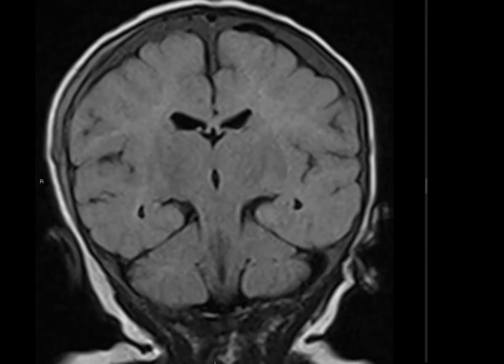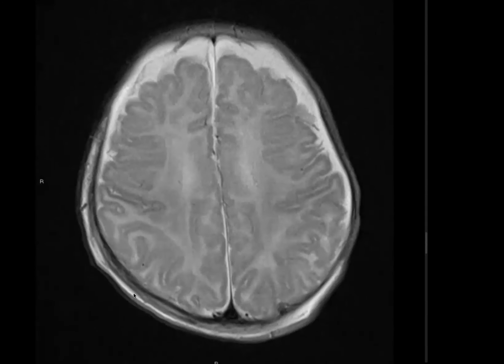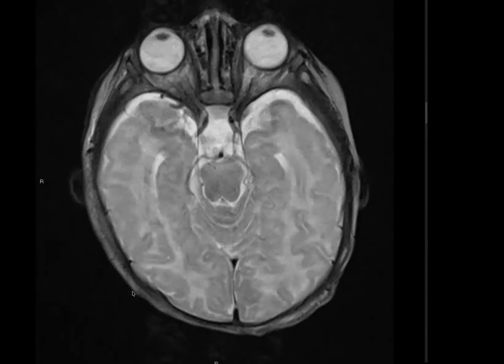Also to look for contusions, to look for hypoxic ischemic encephalopathy changes. SWI will show me chronicity of blood products that I want to see, or if there are small parenchymal injuries like DAI or shearing injuries that are CT occult, MRI will be able to show all of these. But yeah, again, I'm just nitpicking at this point. Well done with this. You got the main diagnosis.